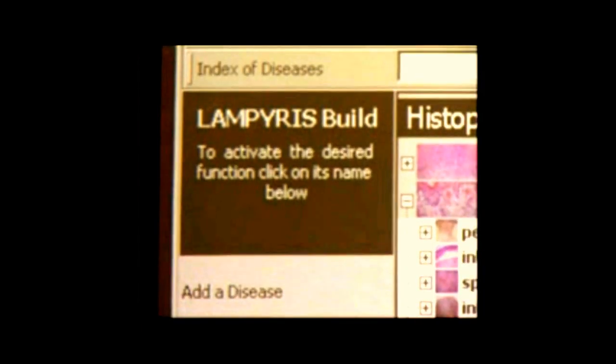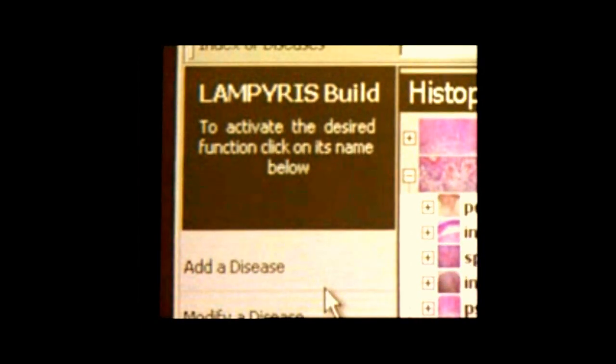It is also possible to create a new disease, filing it in a precise pattern-sub-pattern path, typing a new text, adding differential diagnosis, and adding the histopathological characters that exactly describe the new disease.